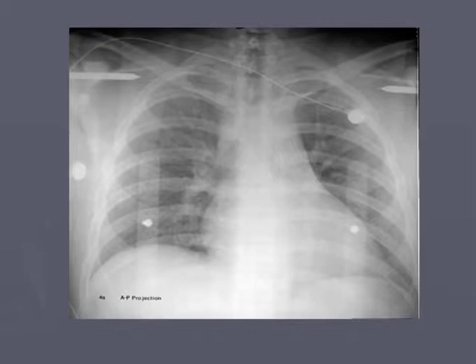If you had shadow puppets and you put your hand closer to the light source and farther away from the wall, the shadow will be larger. If you put your hand closer to the wall, the shadow will be smaller. Same thing happens with X-rays. The closer your heart is to the X-ray source and farther away from the film, the larger the heart will look. So if you're thinking they have cardiomegaly, please look at the projection. Was it an AP view or a PA and lateral view? That may also help out. Now, looking at this guy right here, I would say that he probably has a little bit of heart failure. It does look a little fluffy, though I don't see any pleural effusions. But we'll get to that in a minute.